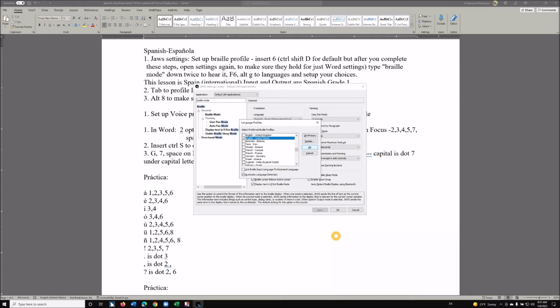If you cannot remember those, go ahead and just tab around. You'll hear it. You do want automatic language detection. That's Alt-A, or once again, you can tab around and hear that. If you actually have a keyboard with that language, you can link your Braille input language to the keyboard option that you have. I'm going to set English as my primary right now, Alt-S. English - United States, primary check. 31 of 68. And enter. General page.